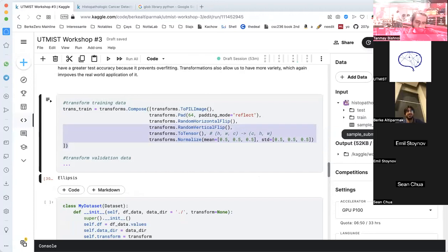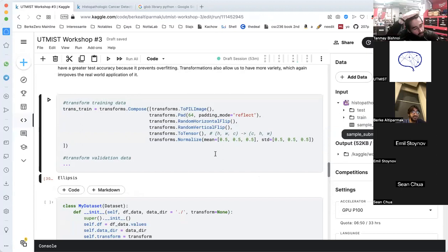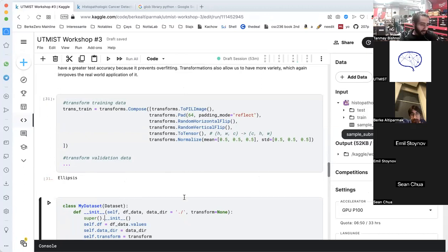Tama, you have a question? Yeah, I'm trying to run it and it gives me an error that I think there's a keyword that goes into the transforms.ToTensor. Is there a keyword that goes in? Because it's not running. It's giving me positional argument follows keyword argument. But I think if you run it, you might get the same error, you might not get it. Mind running it real quick? I ran it, it doesn't give an error for me. Could you check? Interesting. Yeah, I'll check and let you know. Thank you. A possible error that you made could be you forgot to put commas, because I do that as well sometimes.